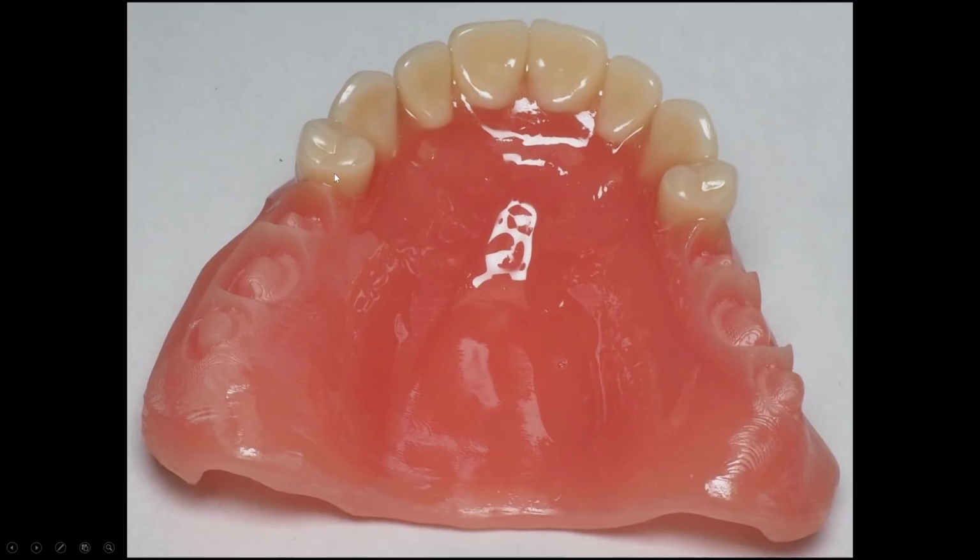If you wanted to cut additional retention or poke holes in the underside of the tooth with a burr, you can do that. And I'll do that and then brush the tooth and the inside of this and then press the tooth in. There'll be a nice definitive fit, and then you can wipe away any excess with a brush and then hit that with a curing light. Your composite curing light will work great for this process, and then you can stick this into a curing unit to do the final cure once everything else is done.